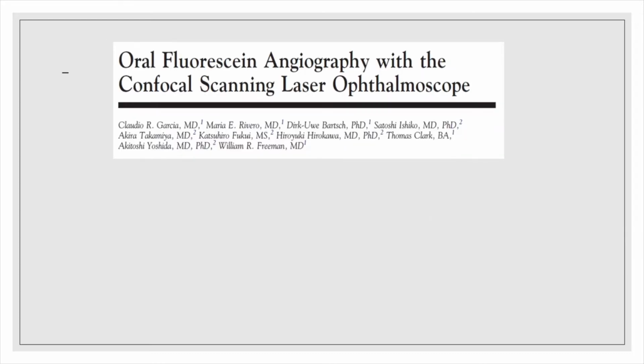So, what we need to understand is this is not something new. It has been there for quite some time, but it wasn't being used extensively because the image qualities that we were obtaining with the FF450 or the digital angiogram or the flood photography were not as good.